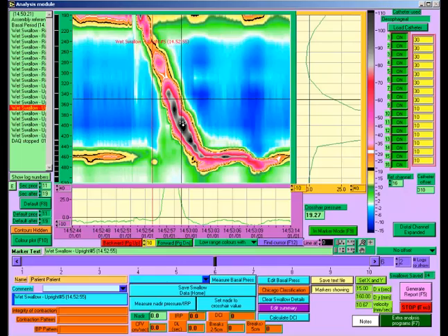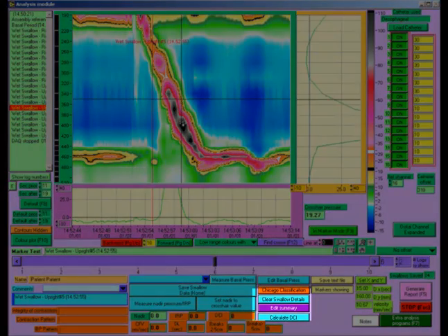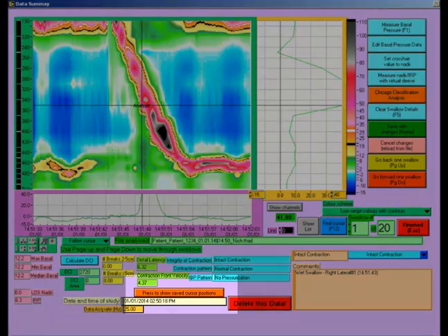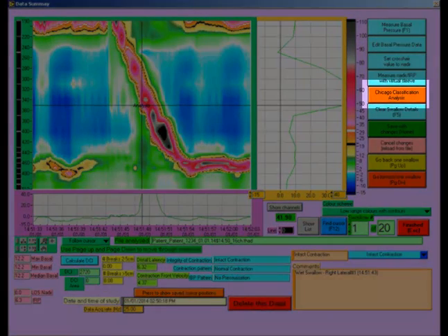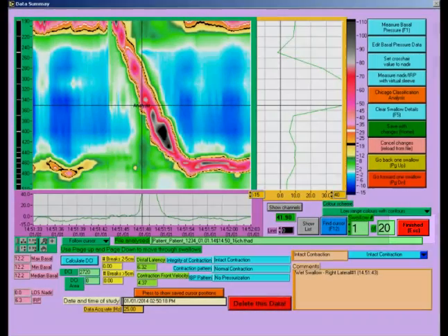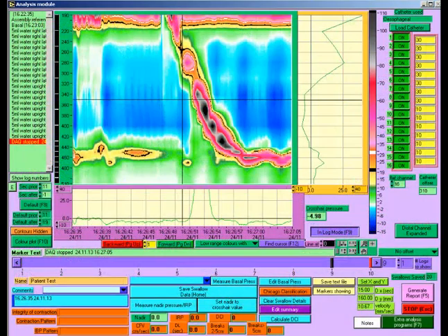If you need to modify any of the swallow data, click on Edit Summary. This screen allows you to modify the data on a saved swallow, and its function is very similar in principle to that of the same screen in previous versions. The differences are that you can review where you place the cursors and can repeat the Chicago classification analysis before saving any changes. Click on the Finished button to return to the analysis screen. As before, this screen can also be accessed via the main menu.